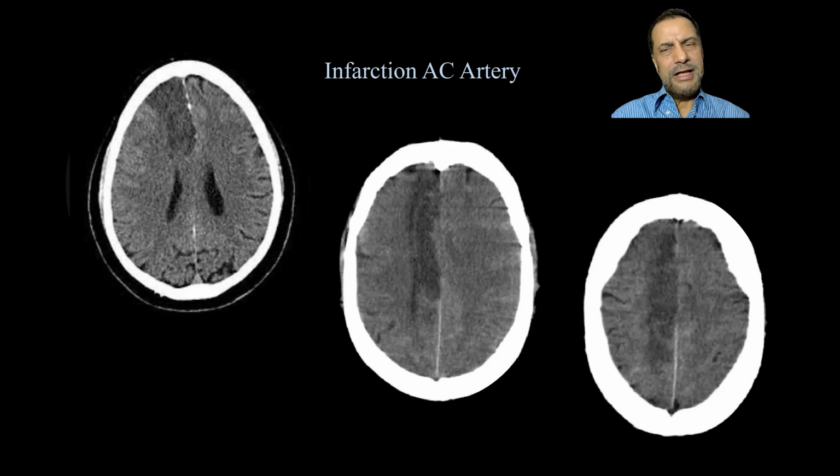Depending on which area the infarction has occurred, you can say which artery is affected. Like in this case, the right side ACA, which is all the way into the motor cortex as well, and like this. So these patients will have a profound left-sided weakness, but not much of ICP, because the shift is not much there.